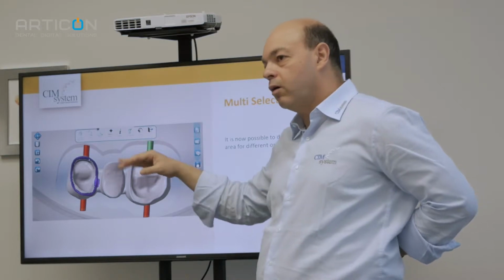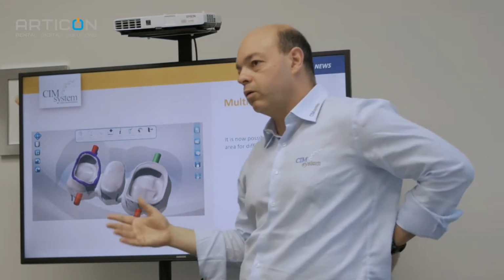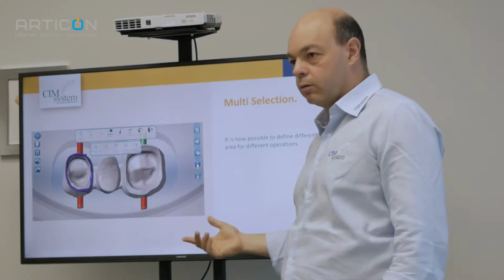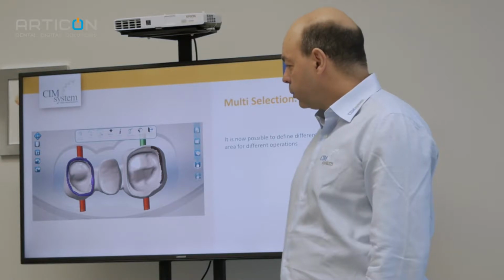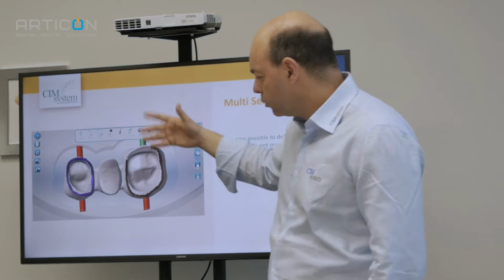And depending on the color, it's a different operation. This is very good because when the automation doesn't work, it's possible to put this. Okay. For example, I have another operation. Yellow, brown, and I don't remember blue.